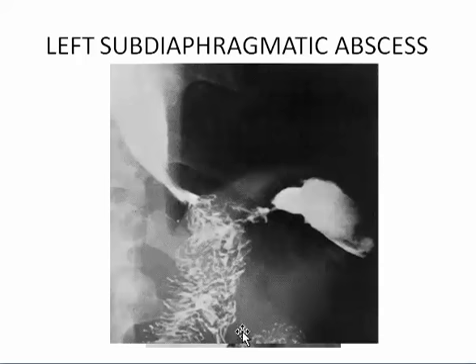This is a post-operative process: esophagus dilated, jejunum, so the stomach is removed, and there is esophagojejunostomy with leakage, resulting in left subdiaphragmatic abscess formation.